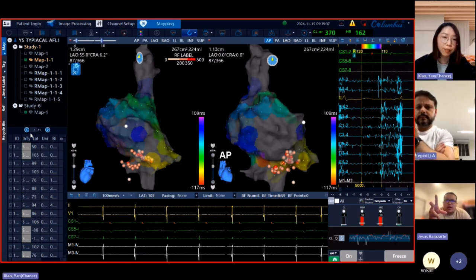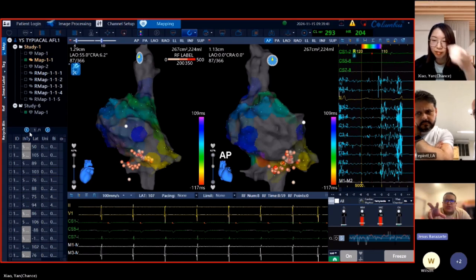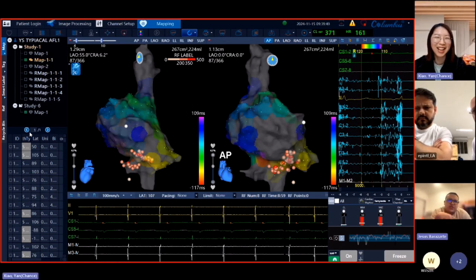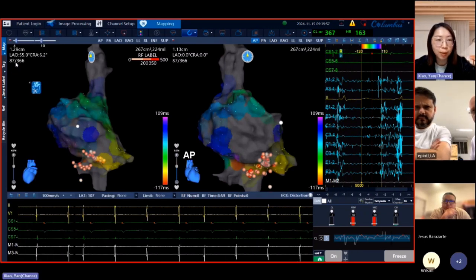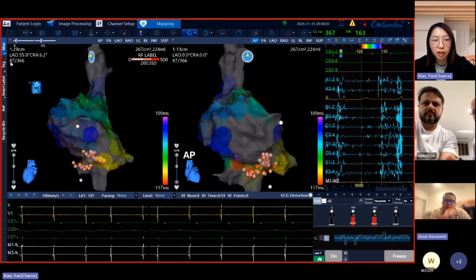Okay. Let me ask you another thing about this new version 4.4002. How many points can we take with the auto mapping? Because in the previous version it was 3,000. Now how much is it? Just firstly, for the value 3,000, we are talking about the projected points, not the points here.